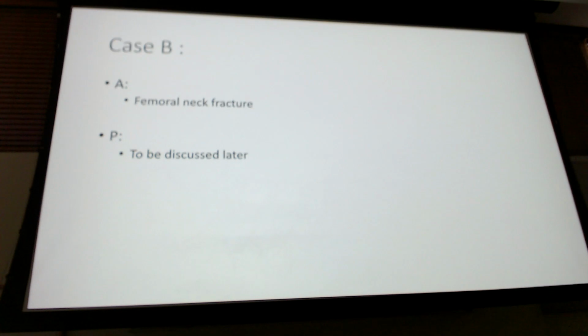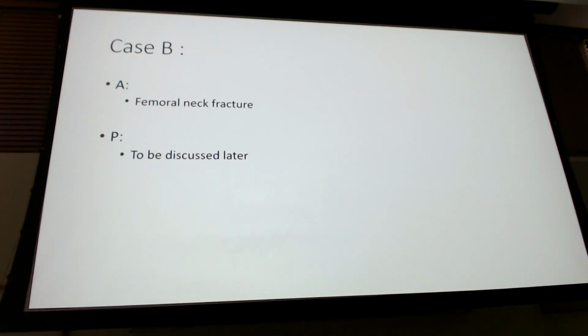Okay, so there's that again. So what is it? A femoral neck fracture. What do we do for it? Next semester. And you can send to ortho as long as you've done your full workup and you can say this is officially yours. Don't just send chronic hip pain or chronic back pain or shoulder pain with no radiological abnormalities to ortho. Don't do it. Ortho surgerize. If there's nothing to surgerize, they don't want to see them.